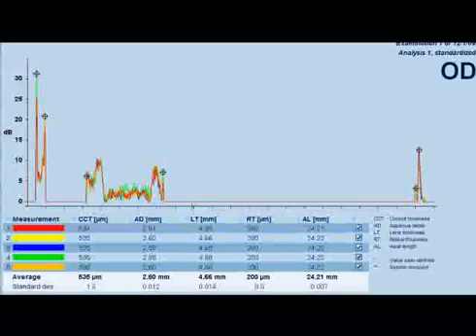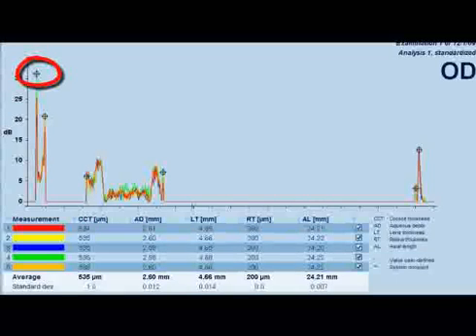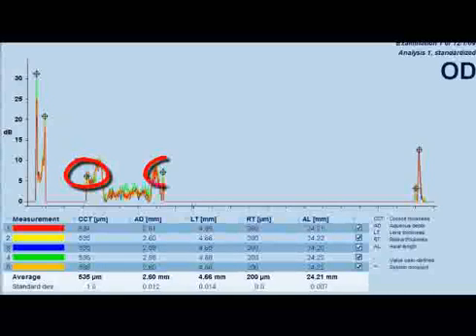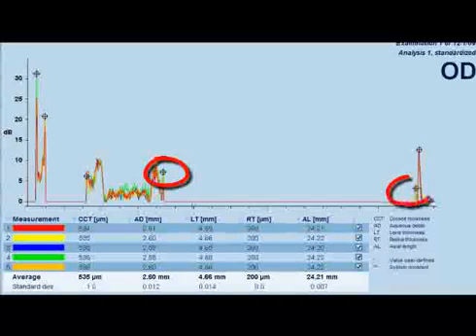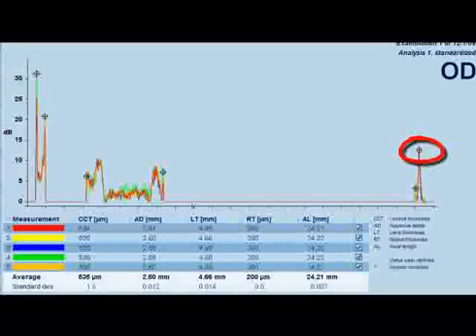In the new window, each gate along the A-scan marked with a crosshair signifies a specific tissue boundary. The gates are the front surface of the cornea, or epithelium, the rear surface of the cornea, or endothelium, the front or anterior surface of the lens, the back or posterior surface of the lens, the inner limiting membrane, and the retinal pigment epithelium.